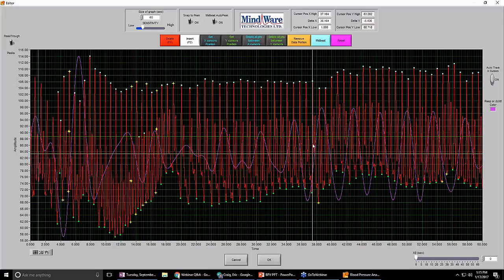The industry standard for RSA is we need 30 seconds of continuous data to get a valid measurement of RSA. That's just due to having at least 3 respiratory cycles within there. So obviously you're free to do whatever you want, but just so you know, the 30-second rule: if anything were to happen around 30 seconds, it's going to invalidate basically this entire segment because we're looking at 60-second segments. So if anything happened right around here, it's again your call in the end, but it would probably be proper to not use that segment in general.